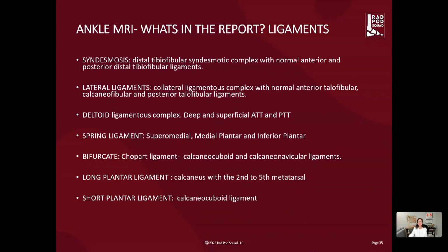Moving on to the ligaments, we'll be assessing the syndesmosis, anterior, posterior, interosseous ligament. We'll be looking at our lateral collateral ligament complex, the ATFL, its relationship to the calcaneofibular ligament, and also the PTFL. We'll assess the deltoid complex, looking at the deep fibers first, moving on to the superficial fibers of the tibionavicular, tibiocalcaneal, or tibiospring. Moving those down to the spring ligament will be our job to assess whether the superomedial band, medial and inferior plantar bands are intact, or are they thickened, or is there a perforation?